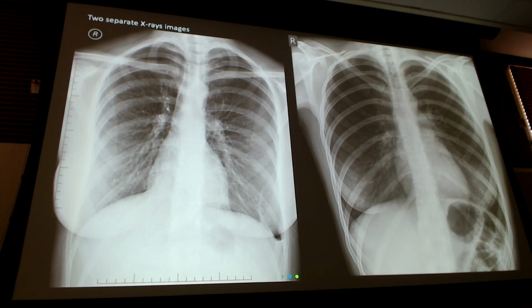On the right picture, is she rotated, or is there trauma? She is probably slightly rotated, because I can see that rib fracture right above it. But what I have here is a gap, and if you look at the head of my clavicle, it does come into the spine a little bit. So I would call that some rotation. You will see that a lot in trauma, because getting the patient positioned perfectly for an x-ray is really difficult to do.